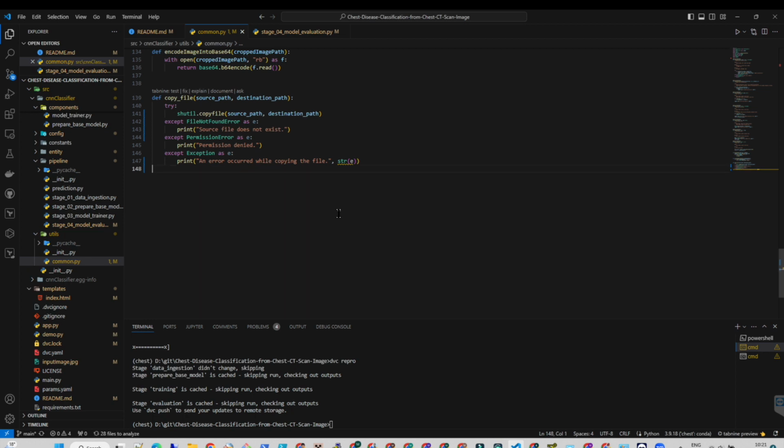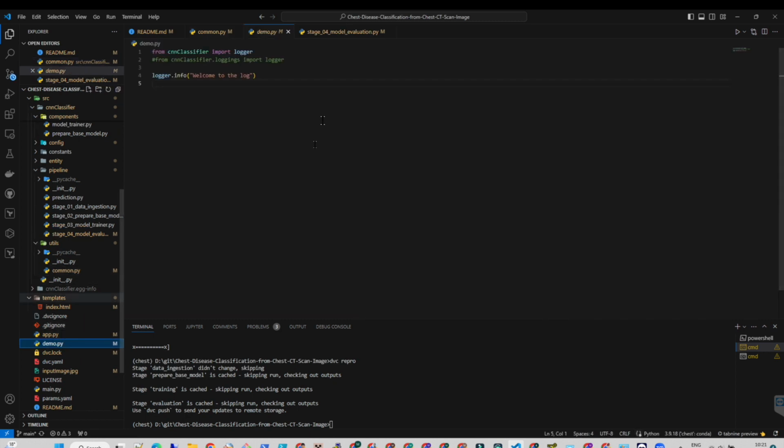I hope so. Let's test this. We'll write everything in the demo file. Yeah, and we have this demo.py file.